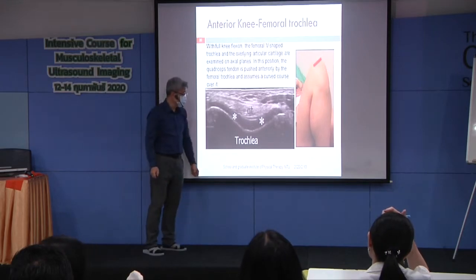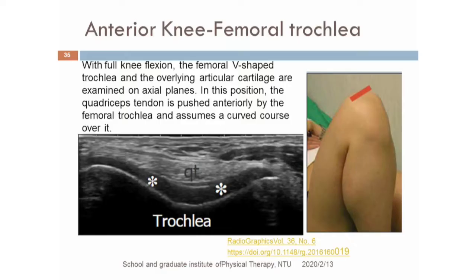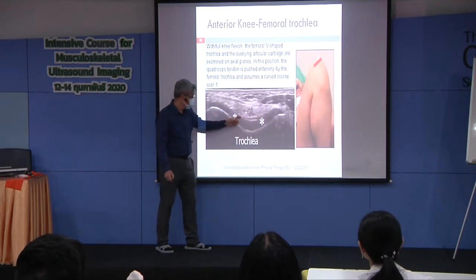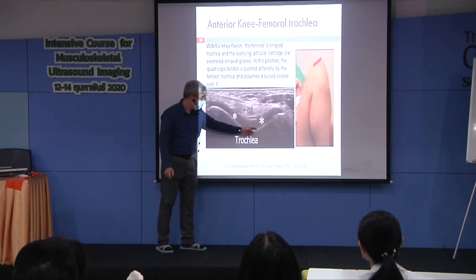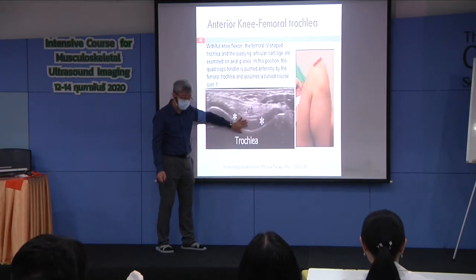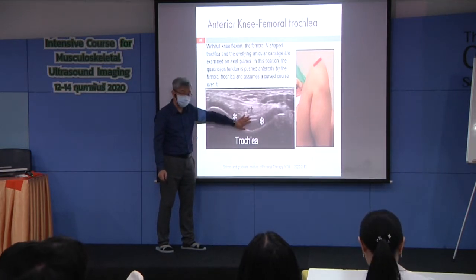So if you want to show me your pictures, you tell me, Professor Wang, this is a picture of my patient. What's wrong with the imaging? Okay, skin, fat, quadriceps tendons, cartilage. So this is not space, it's cartilage. Cartilage thickness represents the stage of osteoarthritis.